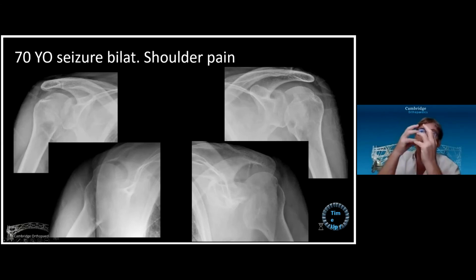That's where the humeral head, with the seizure activity, has gone towards the back of the glenoid, the force has continued, and just like a ping pong ball, it's just crushed the articular surface and the subchondral bone into the metaphysis, into the humerus. But that head fragment is still attached to the shaft. It's still attached to the greater tuberosity. There's no fracture of the lesser tuberosity here. He's just crunched up that subchondral bone.